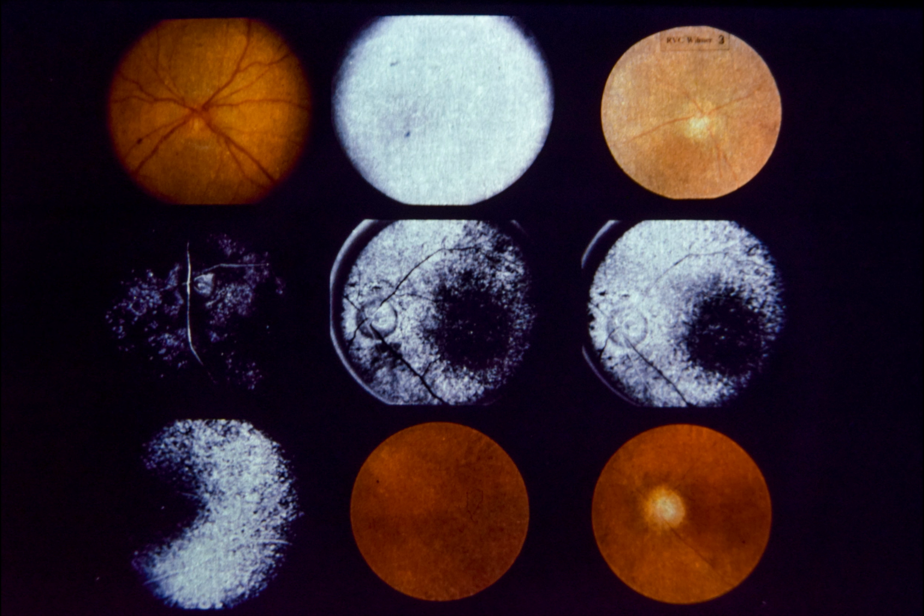Lower center, pigment epithelial mottling is obvious on color photograph taken 3 months later. Also, note narrowing of retinal vessels in this photograph. Lower right, also 3 months after acute visual loss, patient has developed typical picture of old central retinal artery occlusion with pale optic disc and narrow sheathed retinal vessels. Also, note pigment epithelial mottling.